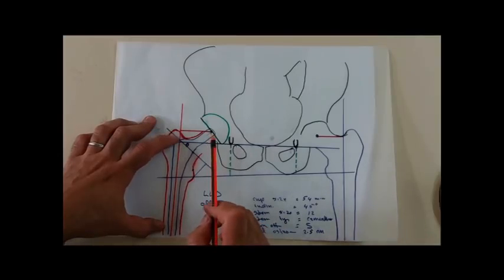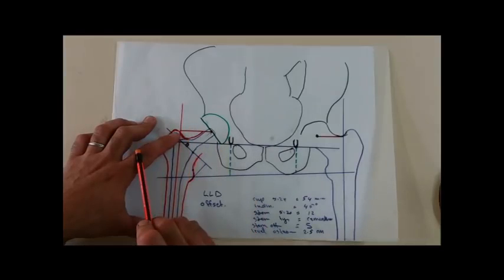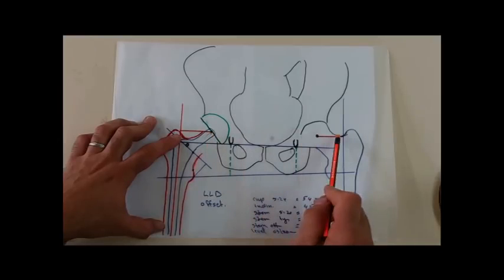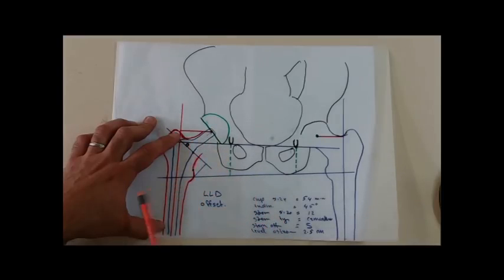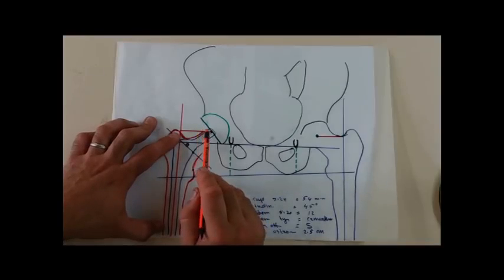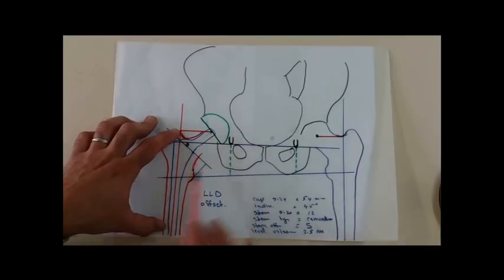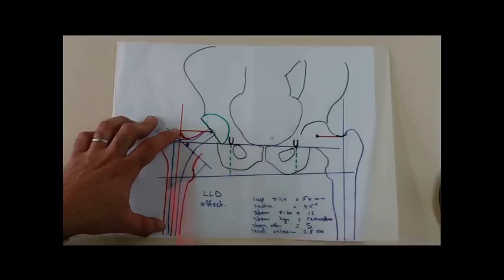For example, if I am comparing the offset of the normal side with that of the replaced part, if the replaced part had less offset than that of the normal, I should increase the offset. By which method? By choosing the high offset stem. That's to say, I choose the template of the high offset. The high offset will increase the medial offset of the femur without affecting the hip length. This can solve the problem if I have less offset in the replaced part compared to that of the normal.